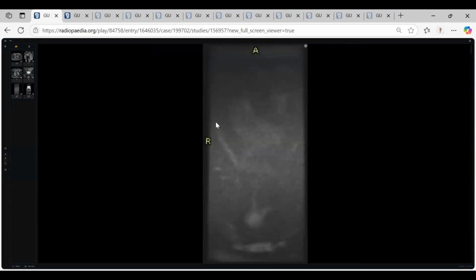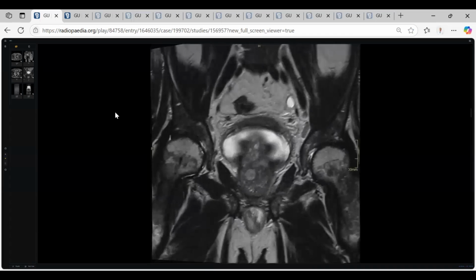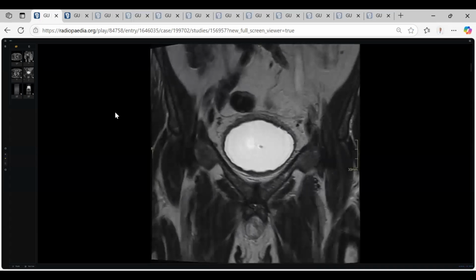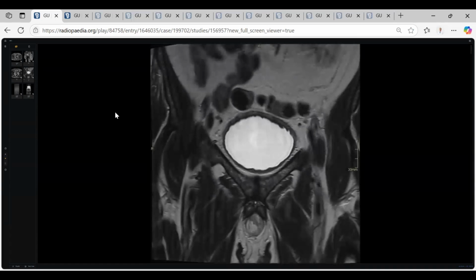I've been provided with MRI images of the same patient. On these images, I can see that there is diffusion restriction in the region of the abscess involving the prostate and the seminal vesicles. I will take a moment to look for any lymph nodes visualized on the diffusion weighted images. So my findings are confirmed on MRI: the principal diagnosis of an abscess in the prostate and the seminal vesicles complicated by cystitis and left pyeloureteronephritis.